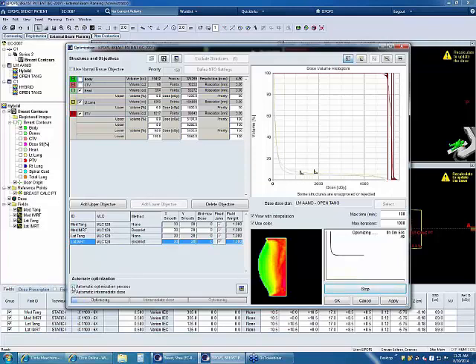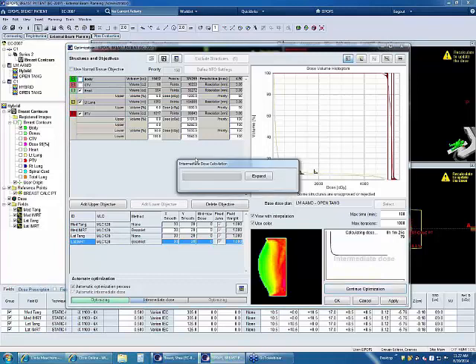That means I can turn these automate optimization buttons on. There's an automate intermediate dose. What that does is it looks at what I'm asking for in here. It looks at what it's giving me. It calculates the error between the 2 DVHs, and then it will adjust the leaf sequences to get me a better agreement. And it's a full AAA dose calc while it is calcing in the optimization window. And that should trigger pretty soon. Even if I didn't trigger it, I could have triggered it down here.